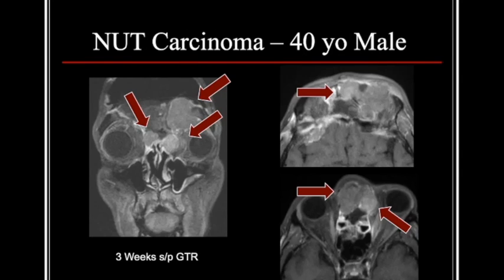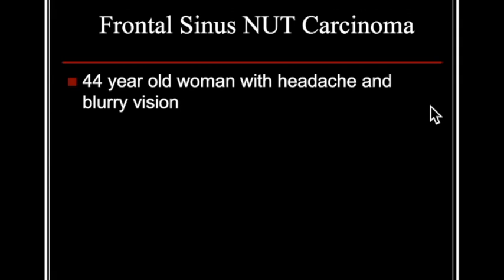He comes back 3 weeks later and has these centimeter-and-a-half, really aggressive and cellular-looking metastases or local recurrences. You can see extending to the left orbit and through some of those areas, which were right at the margin. So, a highly aggressive tumor, very difficult to clear.